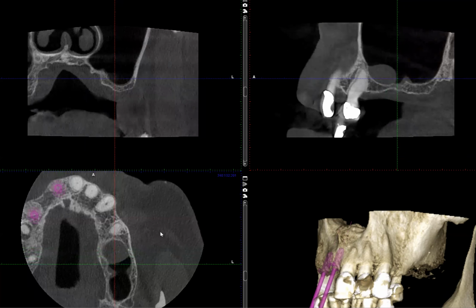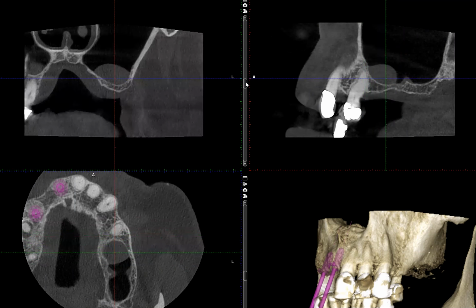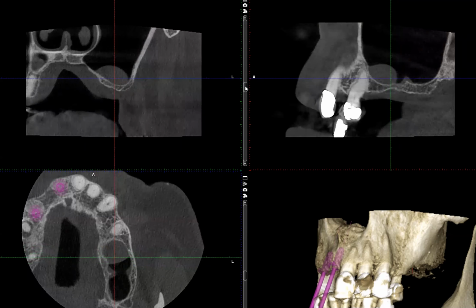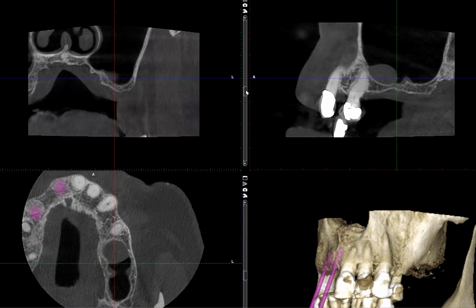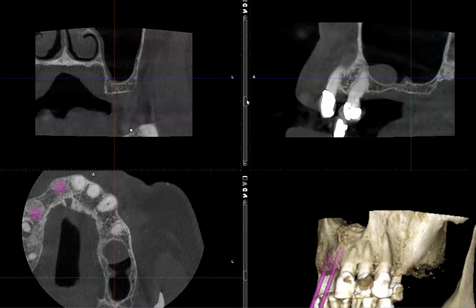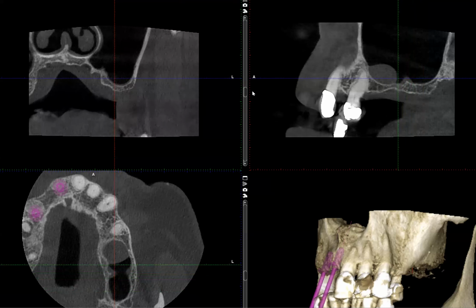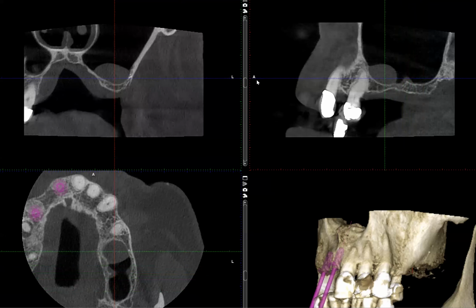Anyway, let's again verify this height of the ridge in this coronal section. So let me go from this premolar and move distally. And again, the height of the ridge is remarkably short, right? So under 3 millimeter, just at that location. And I would say this is even thinner. Simply, this type of ridge would not be a good candidate for receiving dental implants, right?